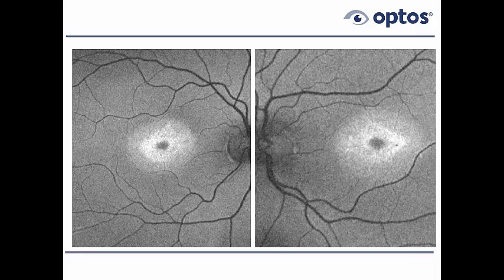Bullseye lesions, by the way, don't automatically mean that the patient has Plaquenil toxicity. Let's say this patient is not on any drug, and therefore we don't think it's Plaquenil or any other drug-related toxicity. The same bullseye can be found in early Stargardt's disease. It can be found in cone rod dystrophies as well, and those are 2 in the differential diagnosis that we must consider.